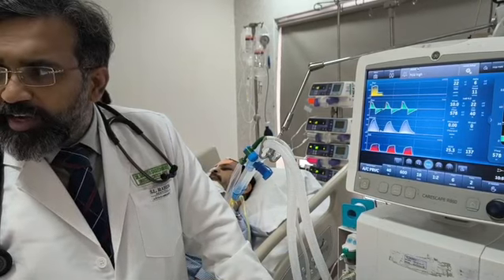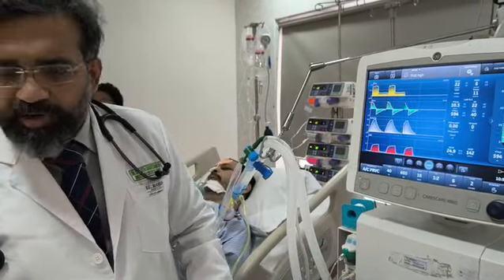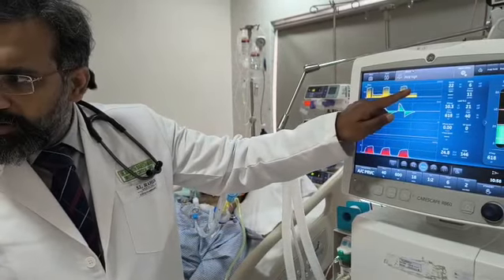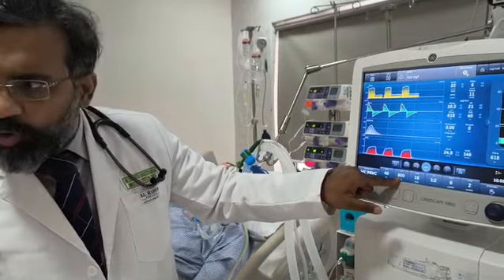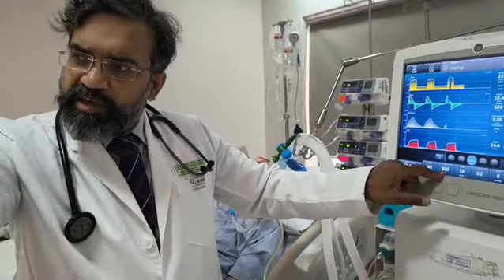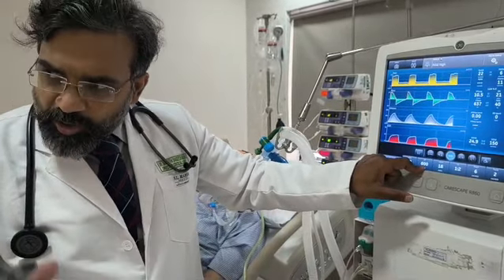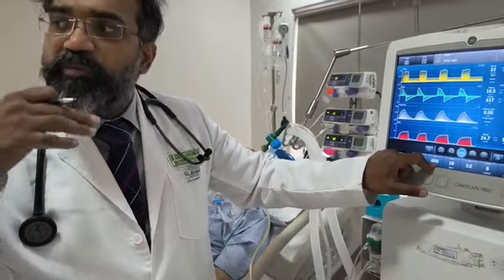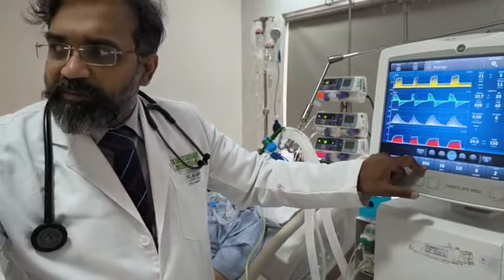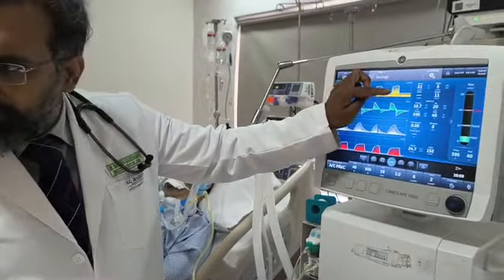So it's kind of ironing it out because it is now pressurizing the circuit slightly higher than otherwise. But of course, we cannot give 600 as a tidal volume. It's kind of got better because you're pressurizing the circuit more. The airway pressure, air resistance is flowing the same. Resistance is not dropping. Why is the resistance not dropping? Because the flow remains the same. Flow is in fact higher because it has to reach 600 mL in that same inspiration time. And that is why you have this ironed out, per se.